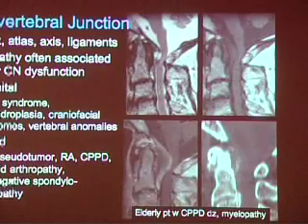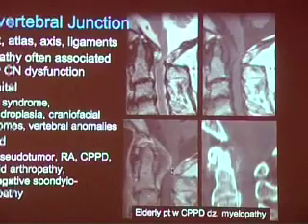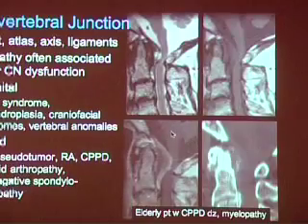When we look at our sagittal T2 weighted image with bright CSF, you see that the cord is pinched and hyperintense. When we give gadolinium, there's some mild diffuse enhancement of this process, and when we look at the CT scan, there's some stippled calcification, which is consistent with a diagnosis of CPPD disease.